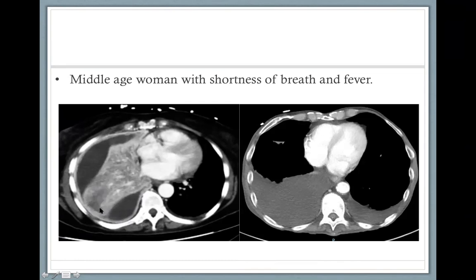So this could be an area of pneumonia, and if it becomes too liquefied, it might turn into an abscess. But to call it an abscess, I need to see some wall to it. I need to see some formation of a mass-like. Because abscess is simply a cavity with pus, which is not yet the case here. I was just trying to answer one of the questions.